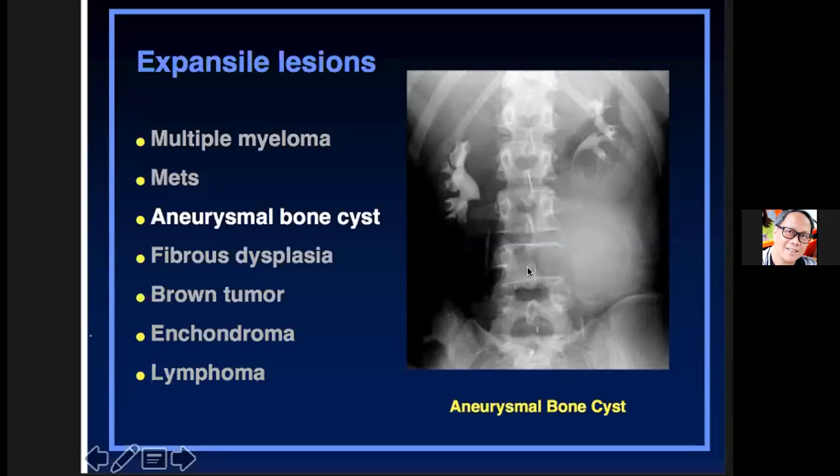Yes, and you see here, this is the rib destruction. This is the destroyed area. So what particular part of the lumbar spine should be found in this area? Look at this normal counterpart here.